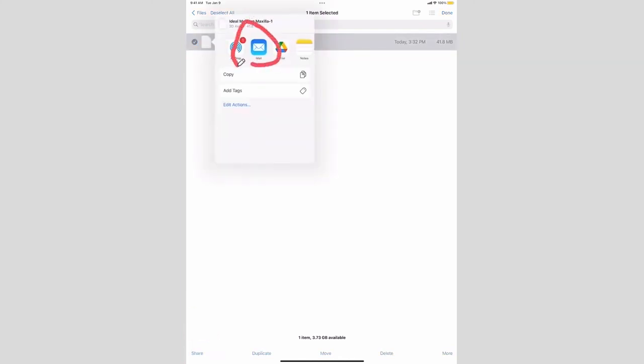Send files to your lab, team, or specialists via email or any other method you desire.